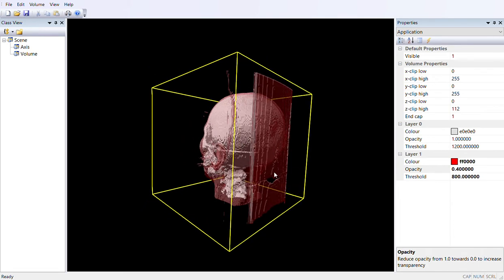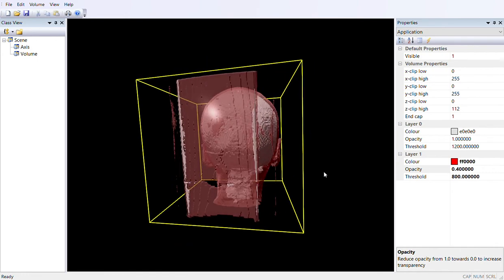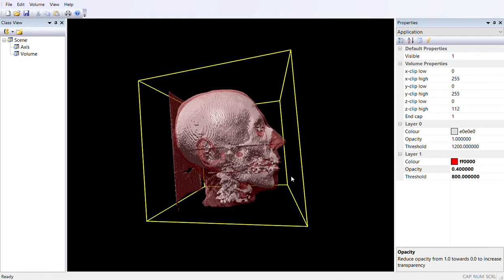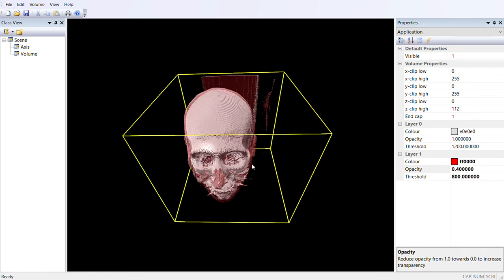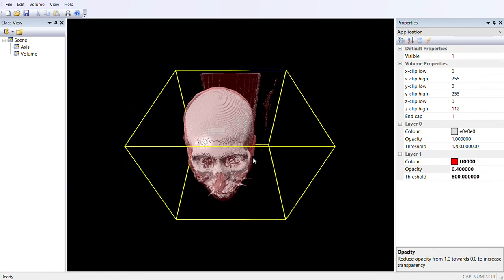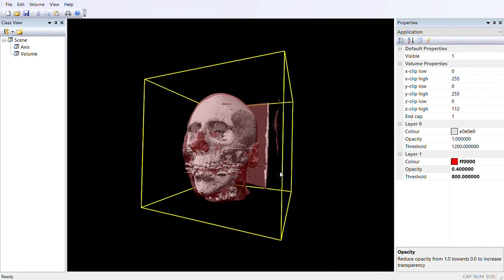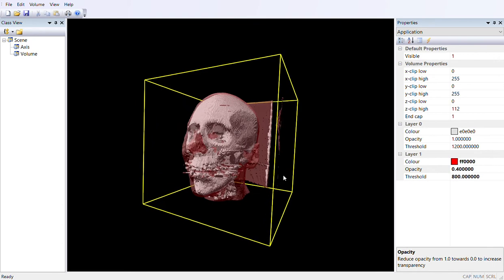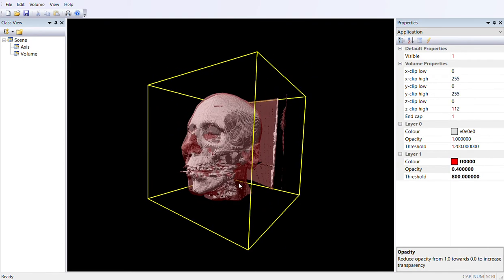That means that every time we change the main axis on which we're viewing this, we have to completely depth sort all of the primitives that are going through here. So you'll see a slight judder as it goes through the different corners, and it's pretty good. There's a little bit of room for improvement in terms of performance, but this is the current state of play.